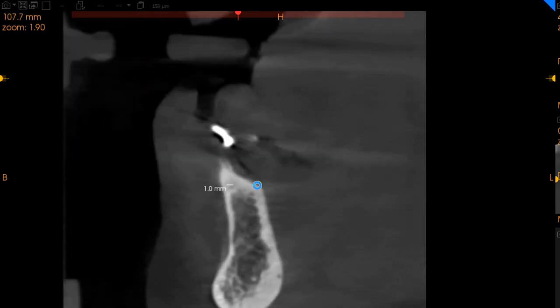This is the lateral incisor. The central incisors are absolutely paper thin ridge. Wouldn't suggest placing an implant here. Moving to the lower left canine region, again we've got slightly good bone here. Approximately 4.6 millimeters of width with a good 10 millimeters of height. First premolar region, again excellent bone, just anterior to the mental foramen. We've got 7.9 millimeters of height and 5.9 millimeters of width.